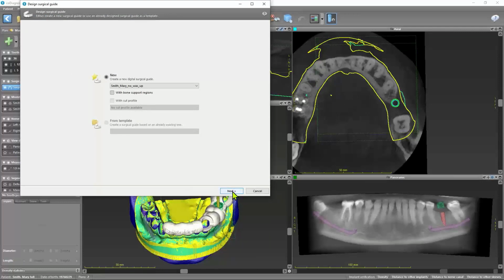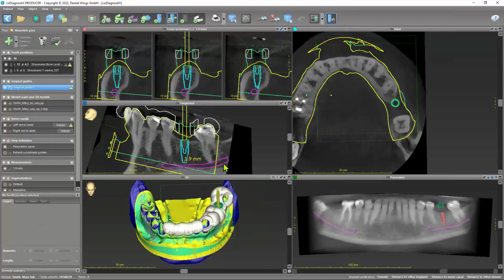And then your guide is newly calculated. You don't have to make the bubbles. You don't have to make the windows or the name on the guide. This is not necessary. I don't do it here. It lasts too long for this basic training, but it's not additional work. You just have to recalculate your guide.